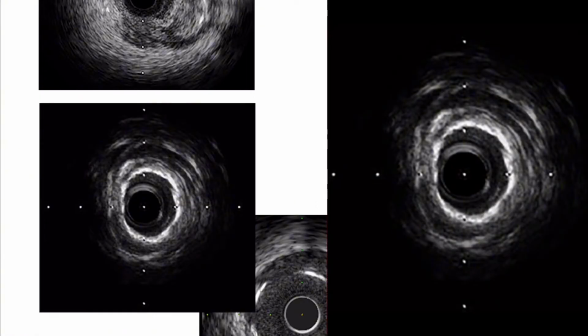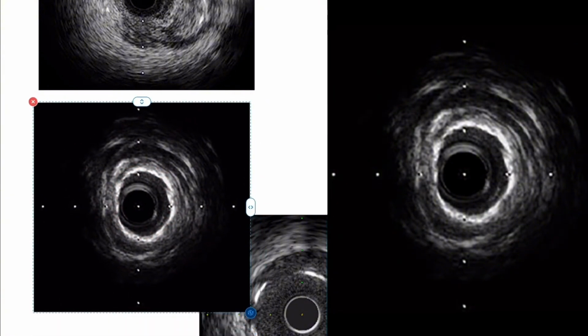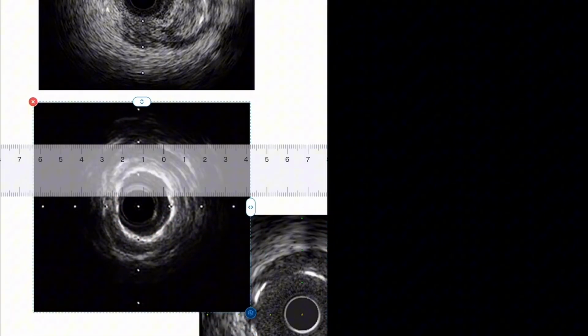The image up here, I can see everything. I kind of just see the catheter, the lumen, this bright white circle thing, and then not a huge distinction out here. A little bit, but not a lot. That's because all of this is a concentric calcium. So the calcium is 360 degrees around the vessel, so I can't really see anything as far as the rest of the vessel sizing and morphology.